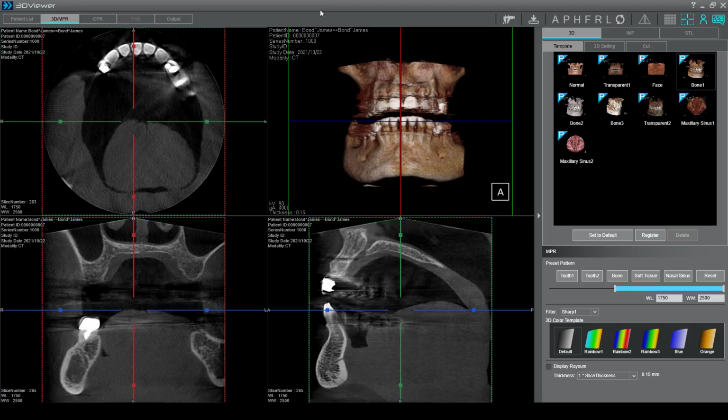Good morning, everyone. Today we are going to be reviewing how to plan an implant, how to place an implant, the kind of workflow that I like to go through. This is going to be different for everybody, depending on how you've learned and what processes you're familiar with, but I'm just going to give you a general overview of how it works.